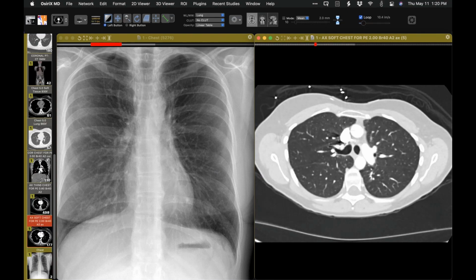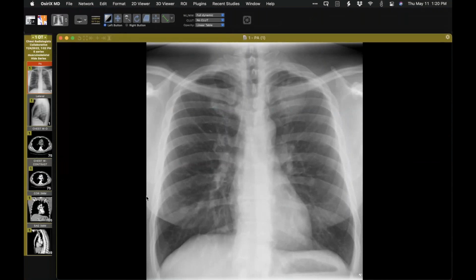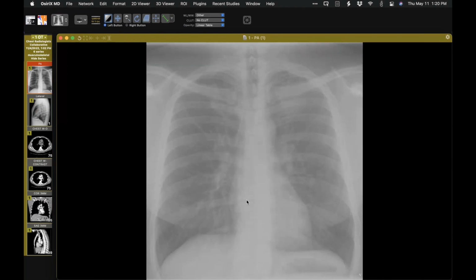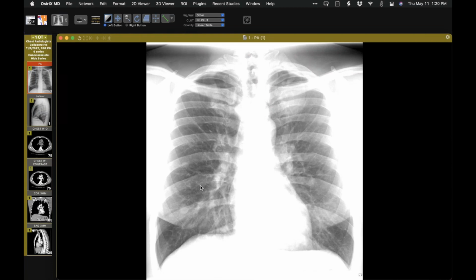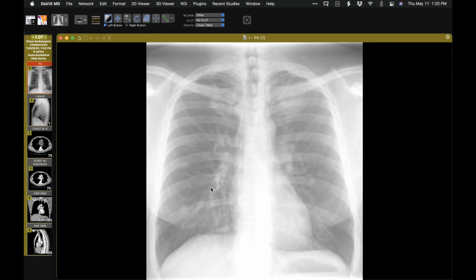Okay, here is a patient with a subtle finding. Anyone want to describe the subtle finding? Real subtle. I'll try to bring it out a little bit. Not so subtle, actually, but there's a couple of findings. There's a bunch of small little nodules, and there's a mass in the apex. Yeah, if I did something like that, you wouldn't see it. So there are nodules, and then there's a dominant thing right there.